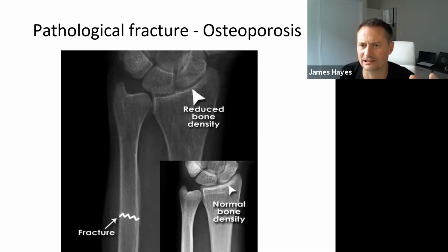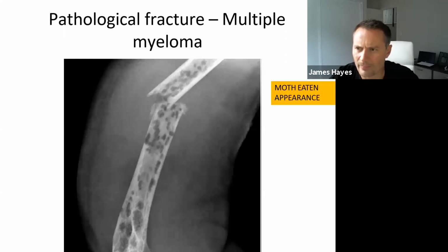But unfortunately, the algorithms that are in the PACS computer systems will make a poorly taken image slightly better. So that's why I call it an Instagram feature. However, someone who knows what they're looking at will reverse that, because it is slightly different if you're a radiographer or a radiologist, that you get a slight burnout in places. And they'll show you exactly this, because that shows osteoporosis as well. And then, of course, you've got a pathological fracture down the bottom.